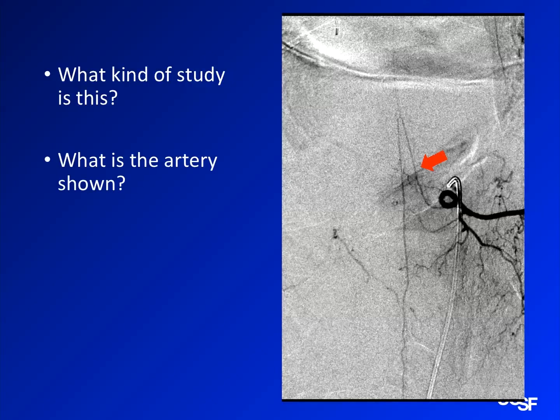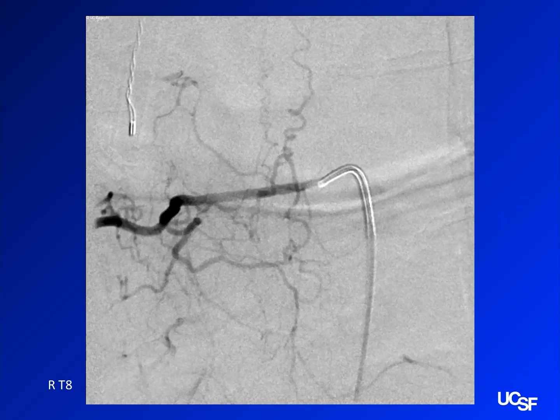And in this case, you're looking for something else because vascular lesions were a consideration here. That's the artery of Adamkiewicz. Here's a different spinal artery. This is T8 on the right. You don't have to tell me more about this. You walked into this too voluntarily. This is a spinal artery. One, it should not be this big. Two, you should not have all these connections. Three, you should not have all these draining veins. Okay, this is what a dural AV fistula in the spine looks like.